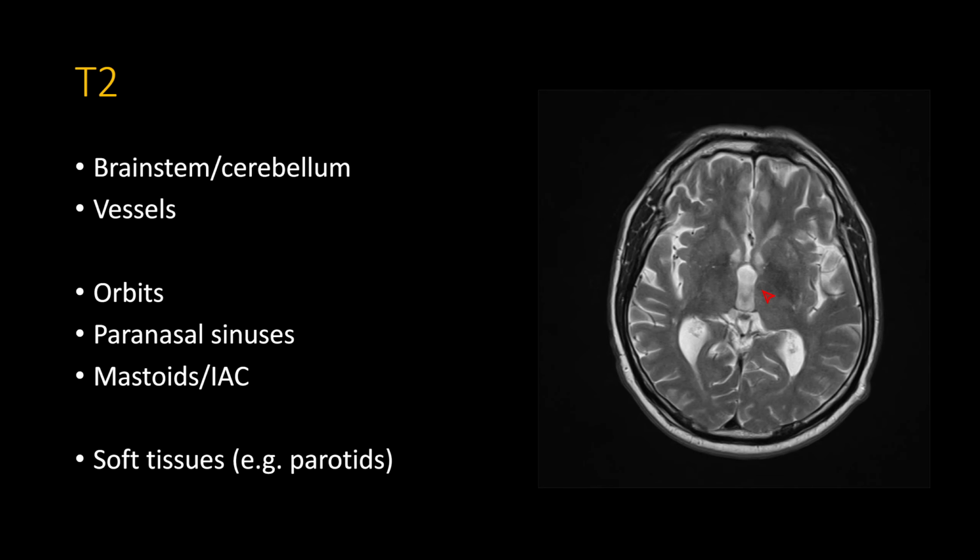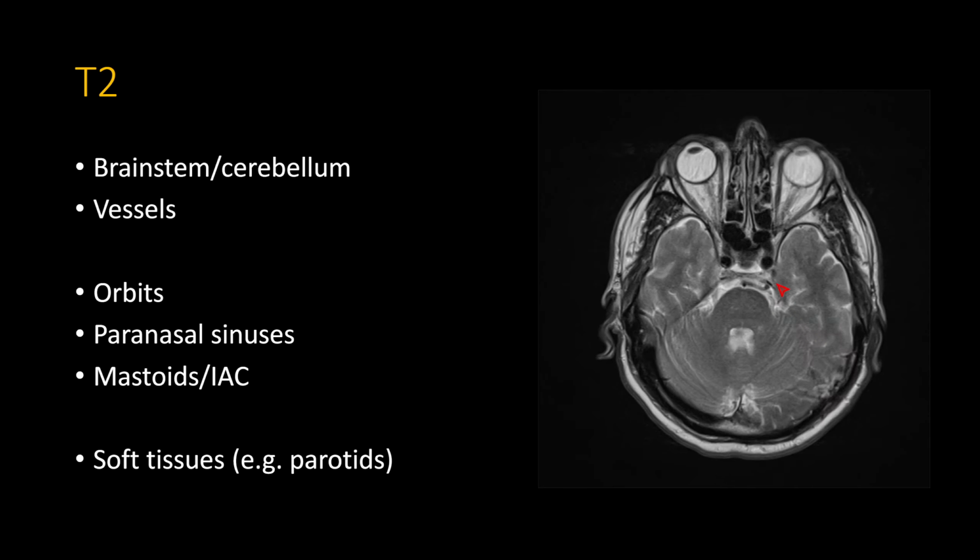But this is not that. This is much more inferior, and this connects directly to the basilar. That's just a persistent trigeminal artery. So you can actually see vascular findings pretty well. This obviously is just a totally incidental finding of no concern.